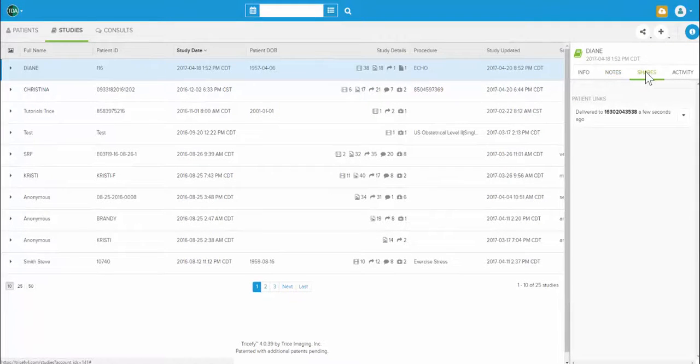Also available is Sharing. Who did I share that text message or email with? Have they viewed it? Can I see what I sent them? And can I reshare their link? If they accidentally deleted it and call requesting another, hit Resend to share their original link.